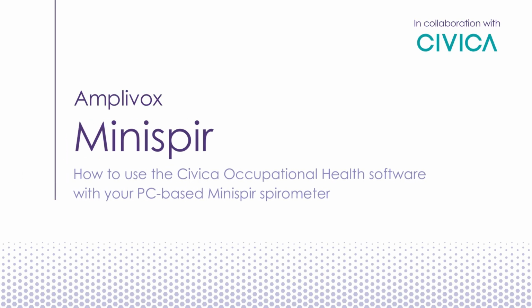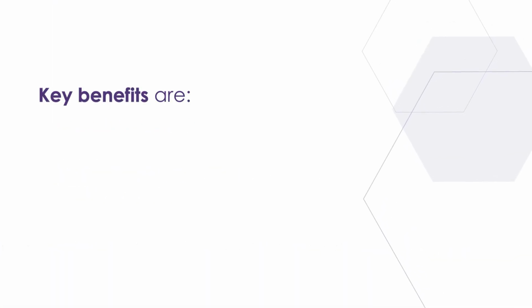In this video, we'll show you how to use the Civica Occupational Health Software with your PC-based Minispir. Why should you use the Civica OH software integration with your PC-based Minispir?